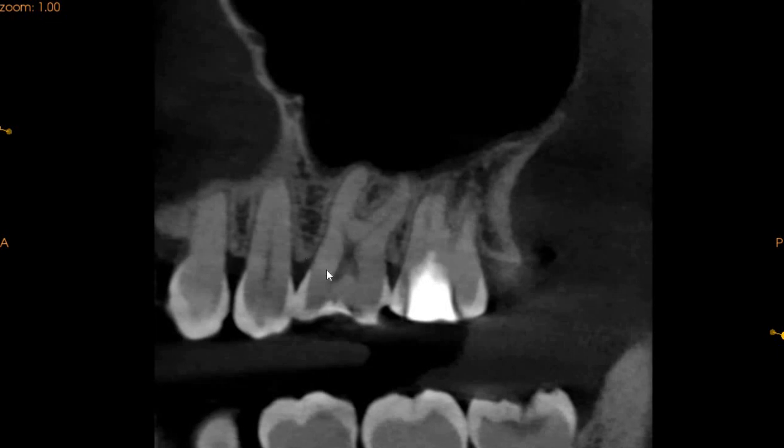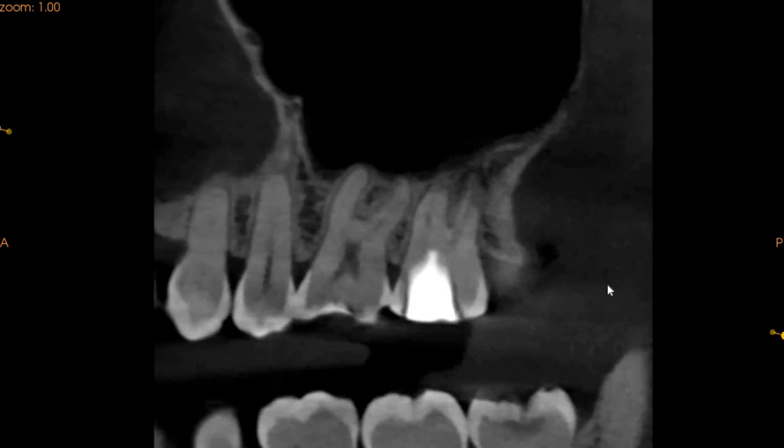The secondary caries is almost close to the pulp horn, which can lead to symptoms of irreversible pulpitis, but clinical correlation is extremely important in this case. If irreversible symptoms are not there, then this can be restored with a filling.